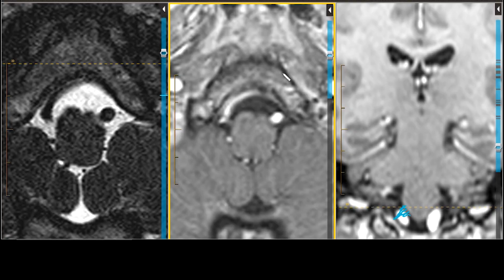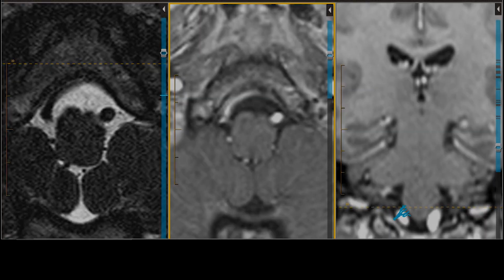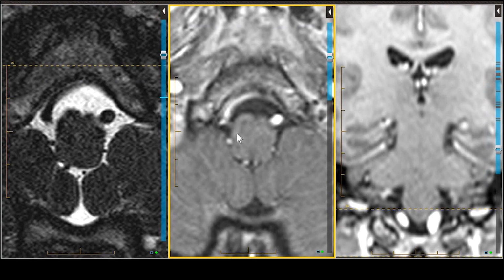I'm making it a little bigger so you can see it, where they'll enter the hypoglossal canal and then down through the neck, eventually passing up over the tongue muscles, supplying the tongue. There are two hypoglossal nerves in the body, one on the left and one on the right. Let's take a look at the hypoglossal nerve in the axial projection where you can see it a little better.